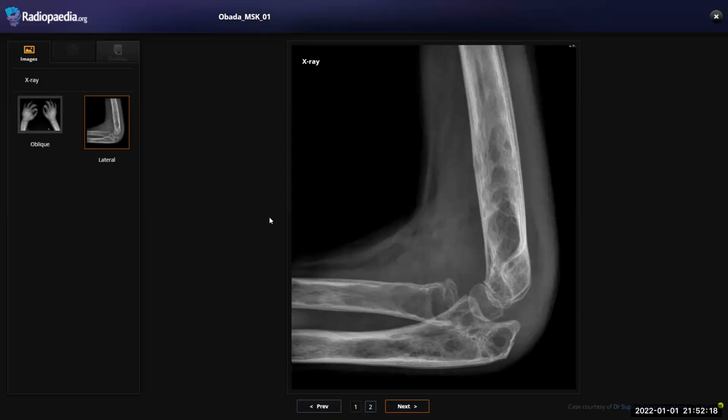My further differentials might include fibrous dysplasia after looking at the involvement of these bones also. And the patient needs a skeletal survey to look for any other involvement, and to look for any associated deranged endocrinology.